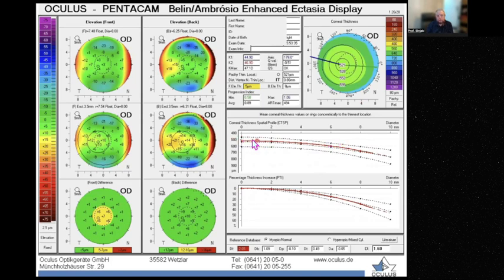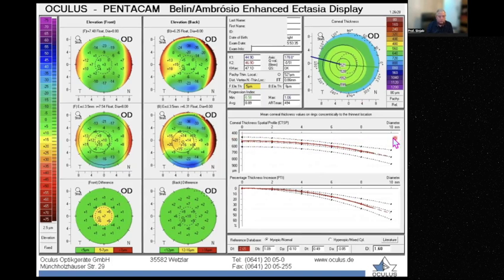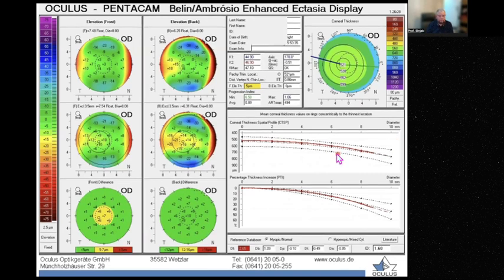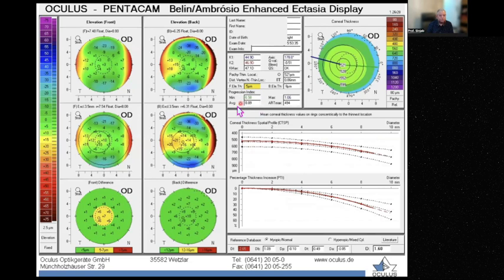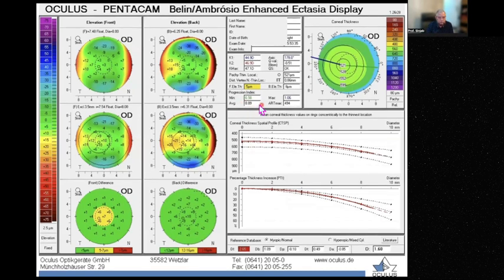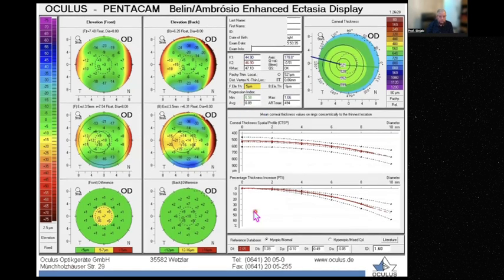And if you see it going flat, then most probably it is a diseased thick cornea, not a normal thick cornea, because a normal thick cornea will even have consistent progression. But if it is diseased, like Fuchs dystrophy, guttata, corneal edema, whatever, then you will find it flat. You look at the average as well. It should be less than 1.2 to say it is normal.